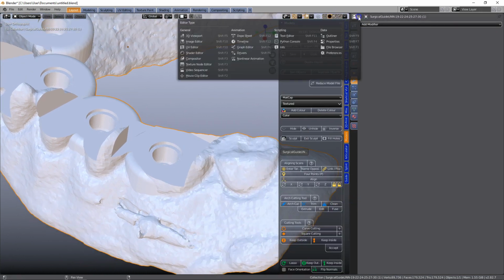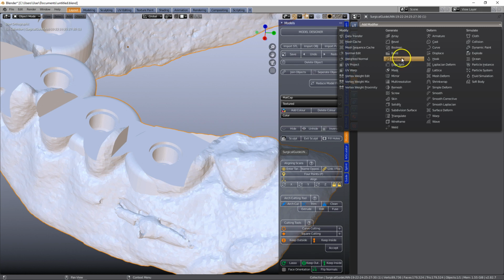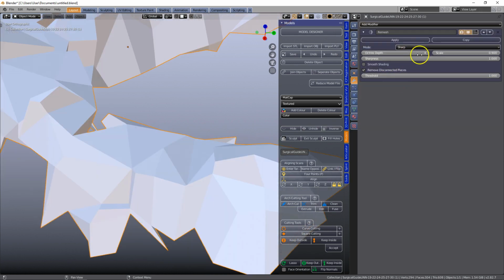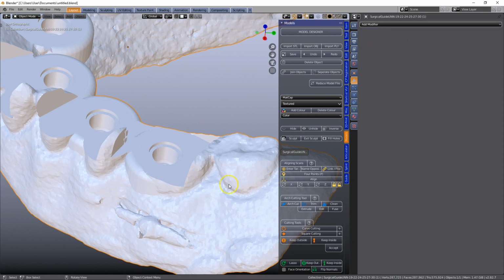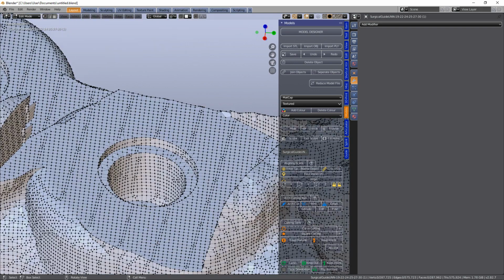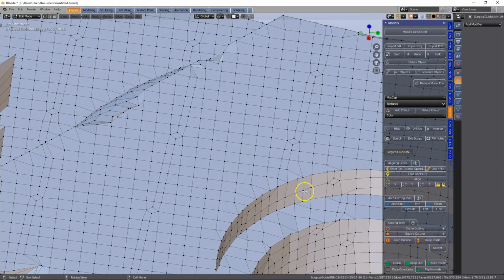In Blender, in the property toolbox, we're going to go to modifier and click on remesh. Here I'm going to set this to 9, and the scale I will set to 0.7. Then we're going to apply this. This will now have remeshed the entire structure, and in edit mode we can see what a beautiful mesh we actually have. This is the foundation for everything, as we need a nice mesh so that we can print or mill whatever we need to do.